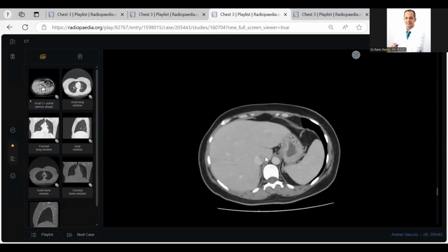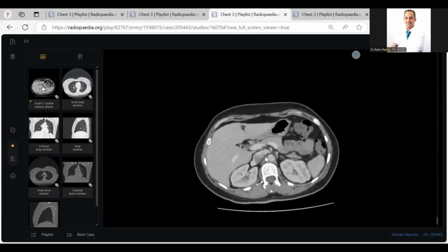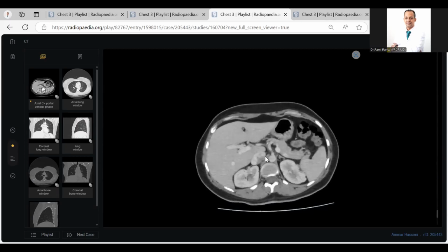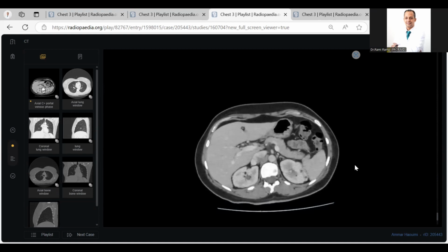What will you do next? Abdominal scan or ultrasound, whatever I can do. If I choose, upper cuts of upper abdomen. Would you see it well? It's the same patient. Yes.